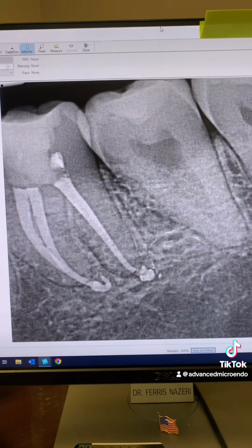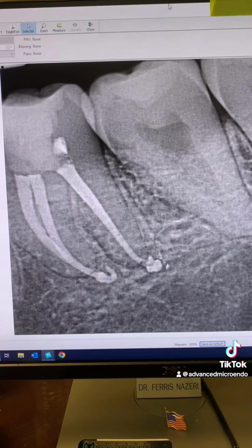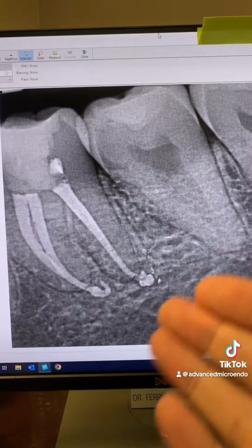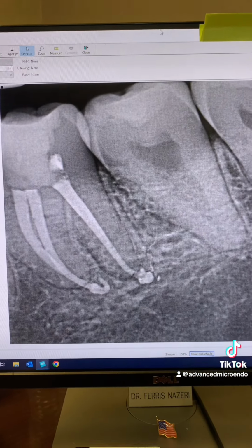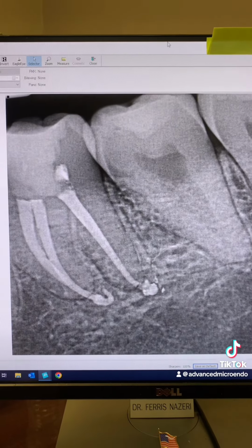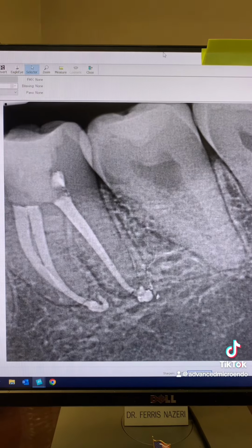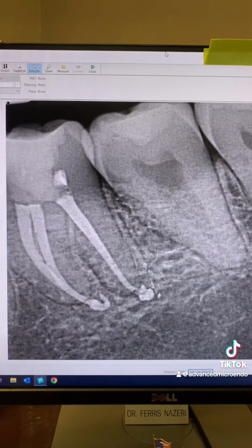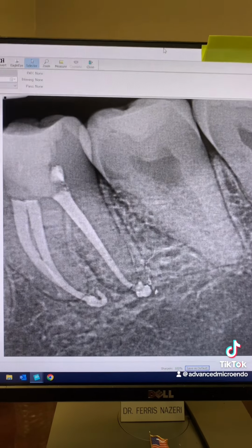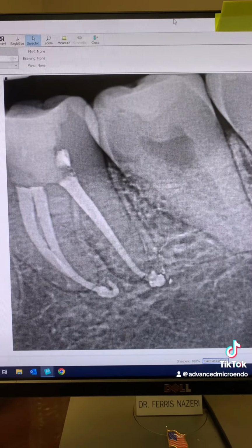Sealer puffs don't cause endodontic failure, and endodontic treatment of such teeth with necrotic pulp and periapical lucencies, as you can see, is still successful and has the same success rate as multiple appointments. Some studies have shown that one appointment root canals in situations like that have actually higher success rate than multiple appointment root canals. All right, so a year and a half post-op of tooth number 30.